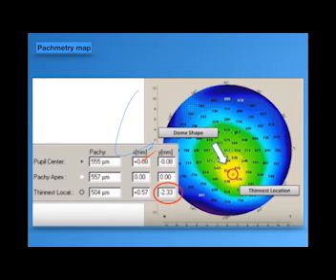It's -2.3, vertical inferior. And the difference of thickness between the apex and thinnest location is more than 10 micron. So this pachymetry map is highly suspicious and abnormal, and this patient is not a candidate for refractive surgery.